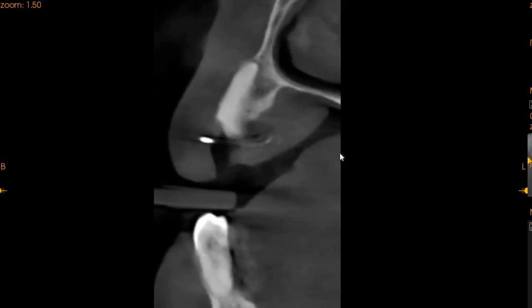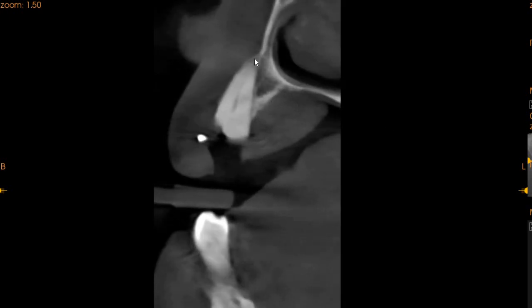This is the upper left canine. My apologies. This is a BDR, has a periapical radiolucency, and you can see has bone support, but we are suspecting this to be below the gingival level. And hence either crown lengthening will be needed or an extraction is definitely indicated. But even if extraction is done, we would not have sufficient bone for an immediate implant placement.